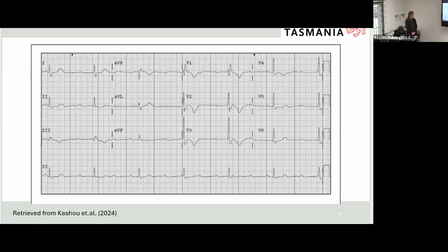Absolutely. Okay, so is our rhythm regular from this one? QRS is, but the P's are all over the top. Okay, so what's our regularity, or what's the distance between each of our QRSs and our P's?